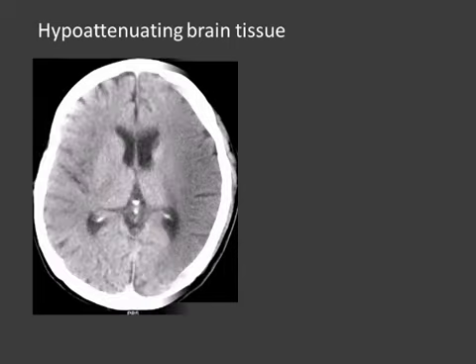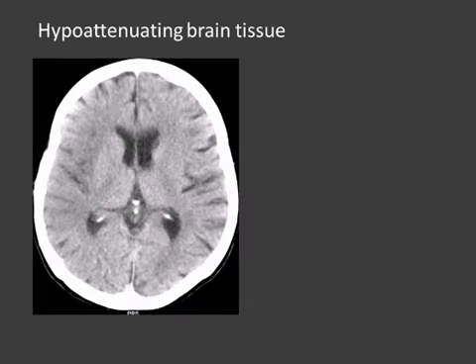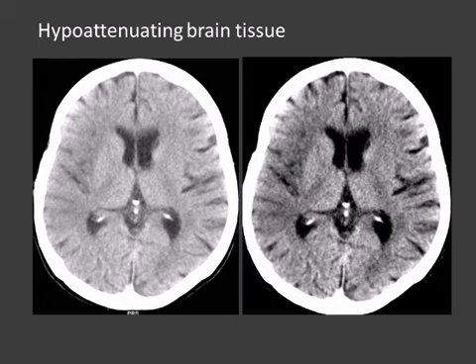Sometimes you will have difficulties, especially if you are tired and if this CT scan is made in the middle of the night. When you look now carefully, you will see that there is a hypodensity in the insular region on the right side. If you are uncertain if something is hypodense or not, then the best thing is to play with the window setting and maybe make a window a little bit harder and go far away from the image, maybe 1 meter, and then you look at it again, and then you are maybe more certain if this is hypodensity or not.